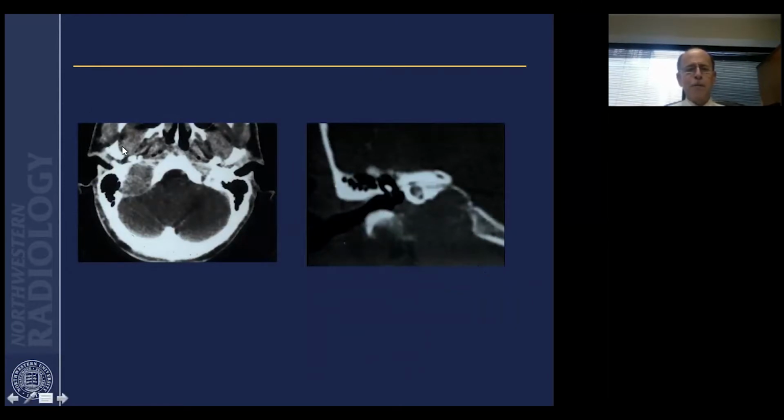Just an example of a very large jugulotympanic tumor that's eroded the jugular foramen and has grown secondarily into the hypotympanum. So once you see that there's tumor in the jugular foramen, it's no longer a glomus tympanicum, it's a jugular tumor that's secondarily invaded the tympanic cavity.